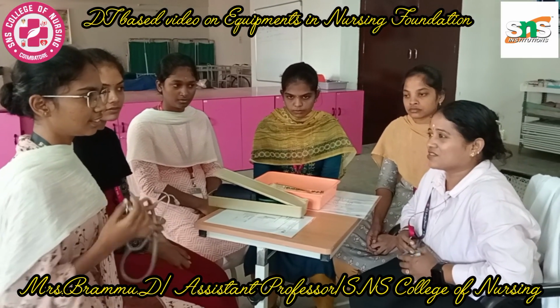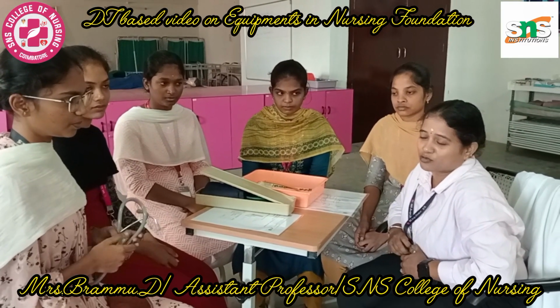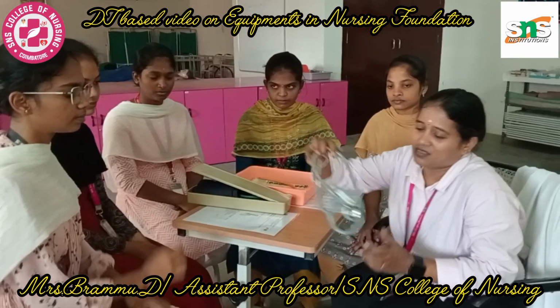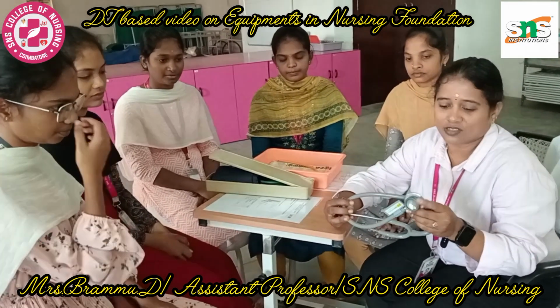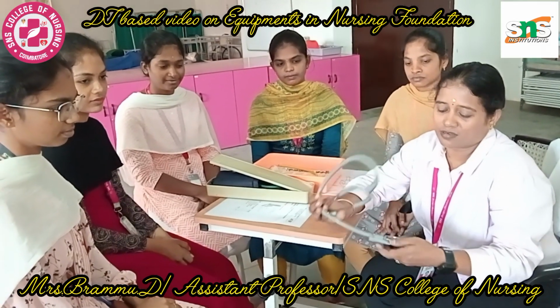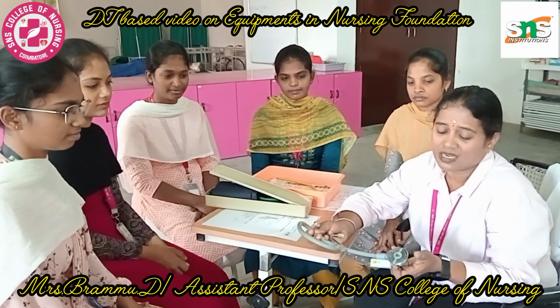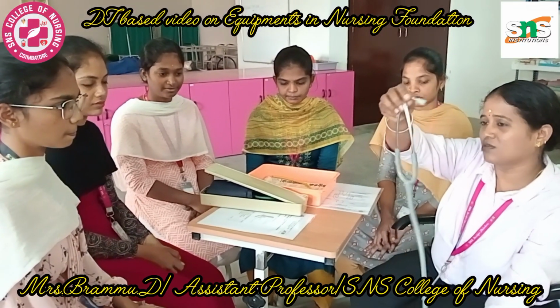Sorry to interrupt, it's not the stem, it's the chest piece. The chest piece has two portions. One is the bell, through which all the soft sounds can be heard, and all the heart sounds as well as the lung sounds can be heard with the help of the diaphragm. So this is how the parts of the stethoscope look.